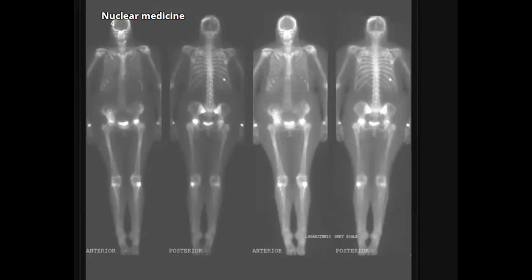It is actually not a super scan for some reason, but okay. Yes, there is a left rib lesion. Actually, this is right, but okay, because this patient is posterior, so this is right. So again, we have something in the hips, if you agree with me. But what do you think about this structure here? Does anyone have an idea? Yes, perfect. This could be a transplanted kidney.